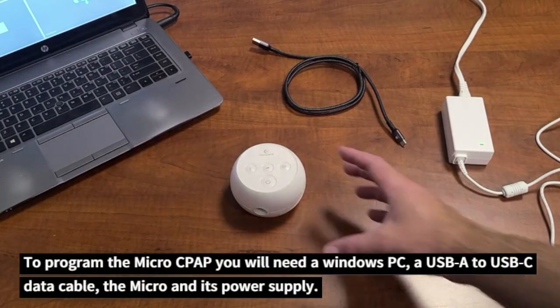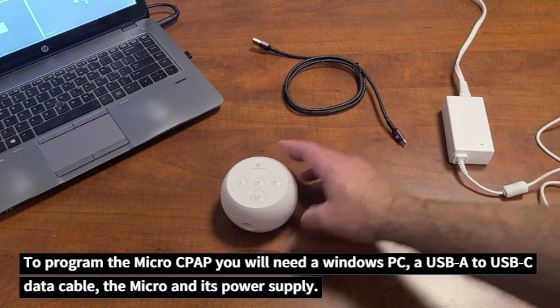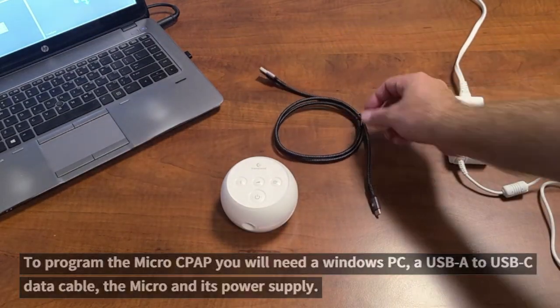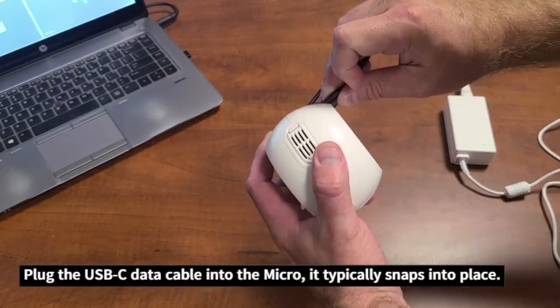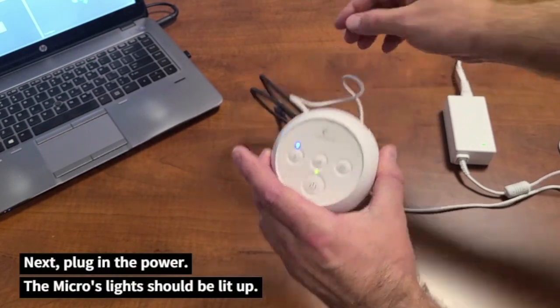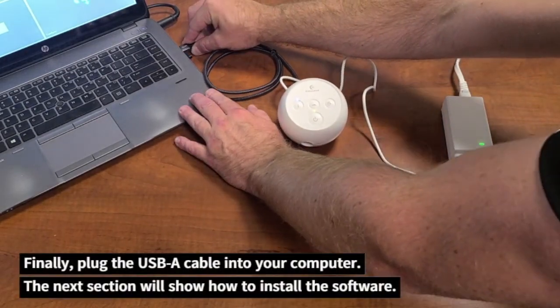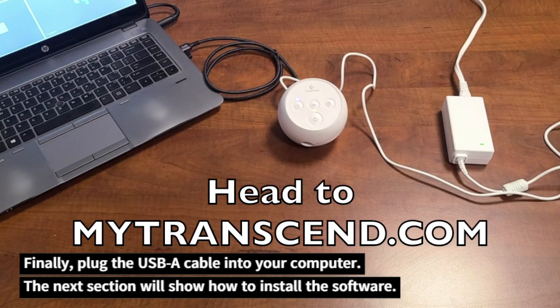To program the micro CPAP, you will need a Windows PC, a USB-A to USB-C data cable, the micro, and its power supply. Plug the USB-C data cable into the micro. It typically snaps into place. Next, plug in the power. The micro's lights should be lit up. Finally, plug the USB-A cable into your computer. The next section will show how to install the software.